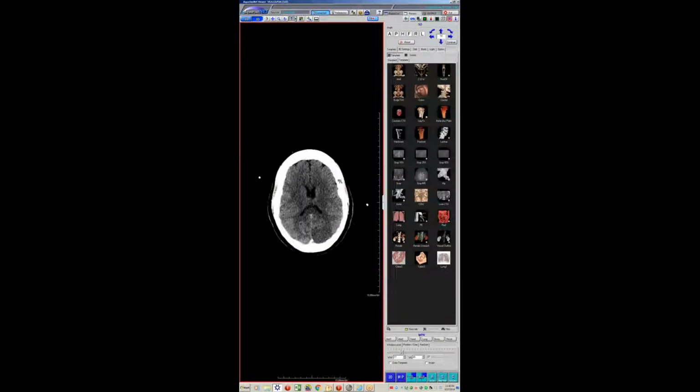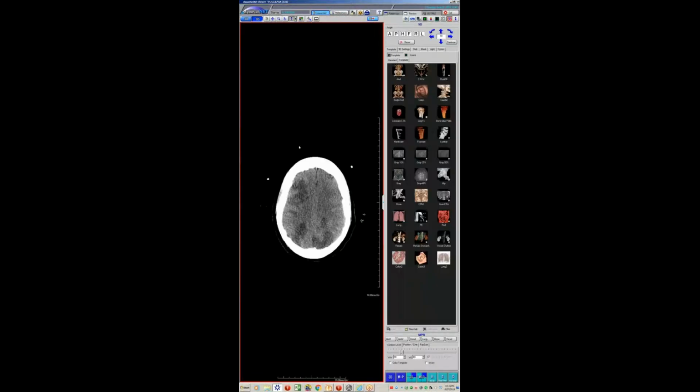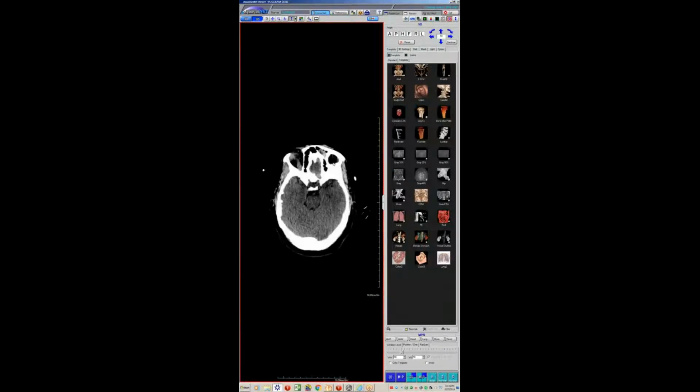And then you can see here, she's starting to develop, and this is literally the same day, all these areas of stroke, and then you can see them progress. This is like 2 days later. So here now you can really see all of this embolic stroke. And then she died. So bad outcome from an outflow cannula thrombus that embolized to the brain, causing massive stroke and death.